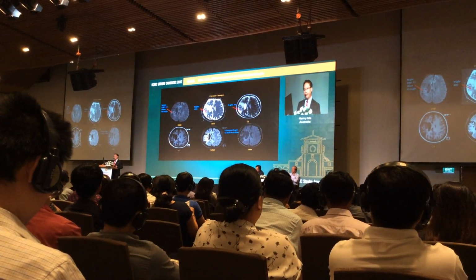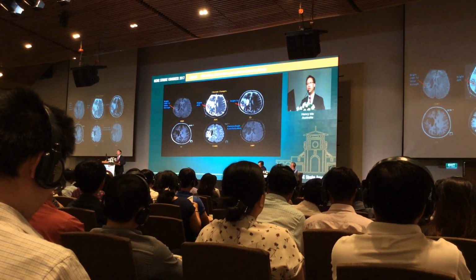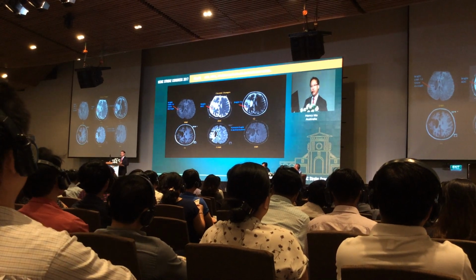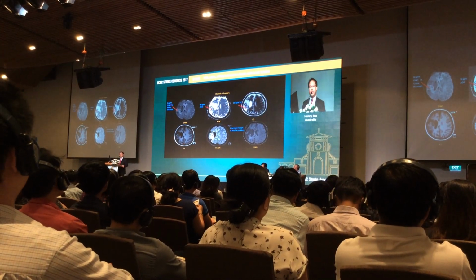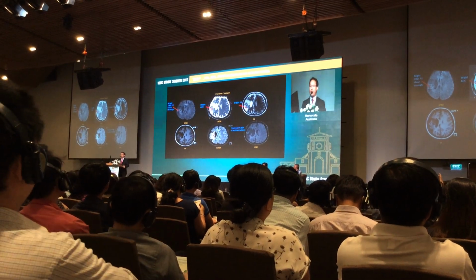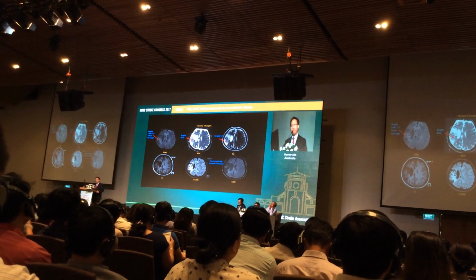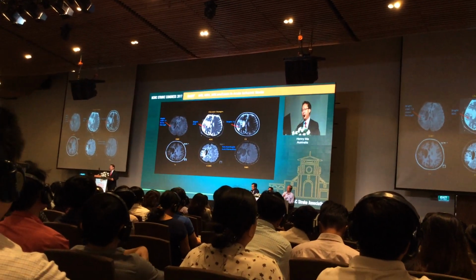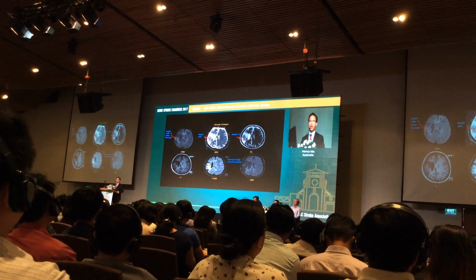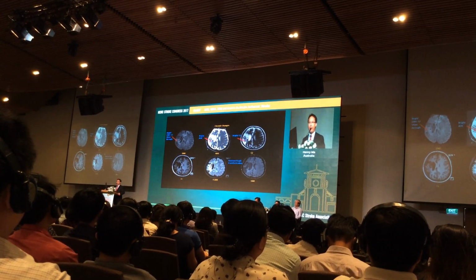But more importantly, in the same patient, if you look carefully at the DWI sequence, it actually looks a bit bright in some areas. Without the other sequences, you would think, wow, that's maybe an early ischemic stroke. But actually the same area looks bright on ADC, and also bright on T2. So this brightness in DWI is due to what we call T2 shine through. It's basically a false elevation or false brightness on DWI. You've got to look at every sequence.